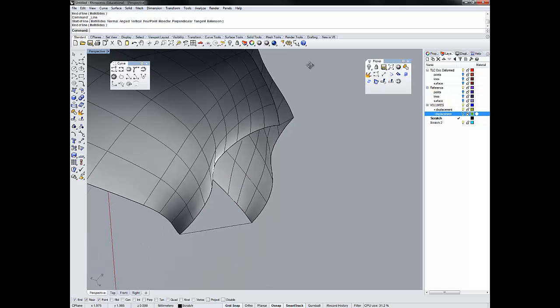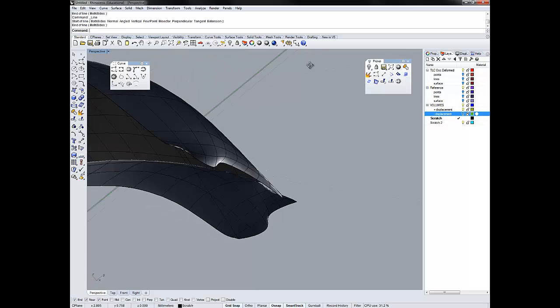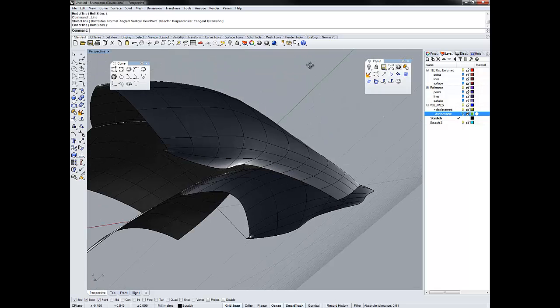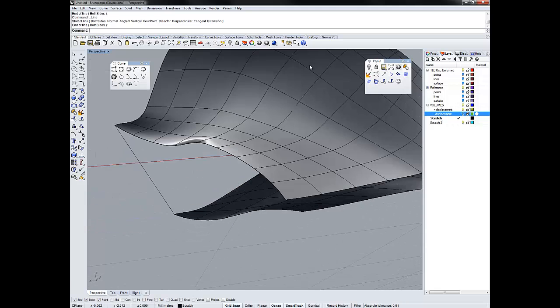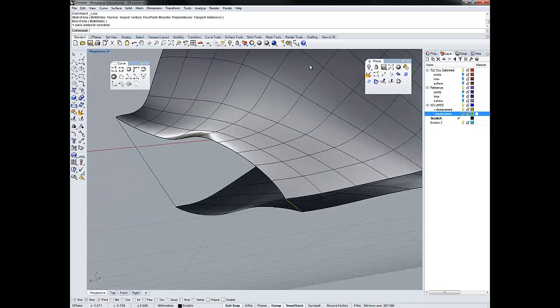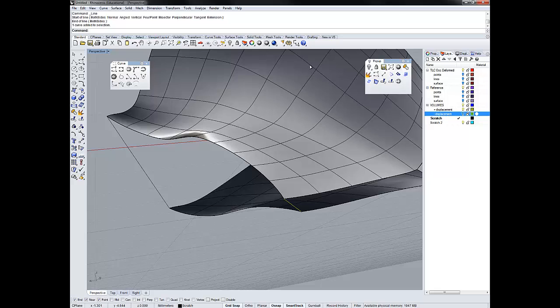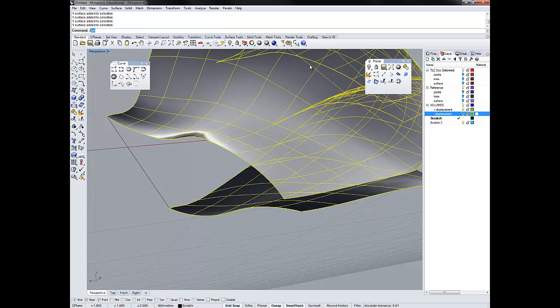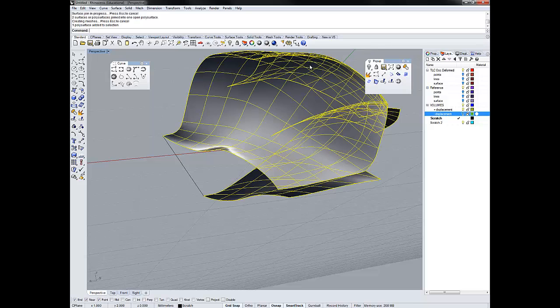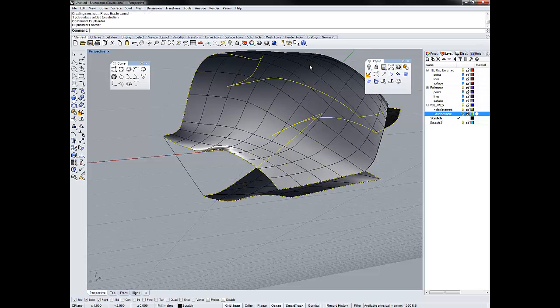And actually for this one, I can see there's going to be some issues with this surface here, probably. Let's actually try and do this one first, because it looks complicated and it'll be a good example. So we left-click, we don't have this line. I'm trying to select that line, and that's because we need to duplicate the borders. But also you'll notice that these aren't joined. So that's our first step. Join these surfaces, join. 2 surfaces or poly surfaces joined into one open poly surface. And then we're going to duplicate the borders, duplicate borders.